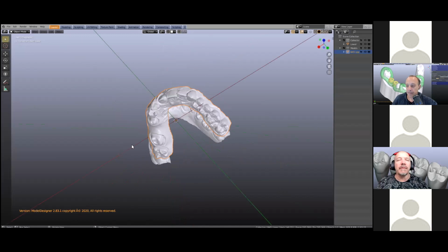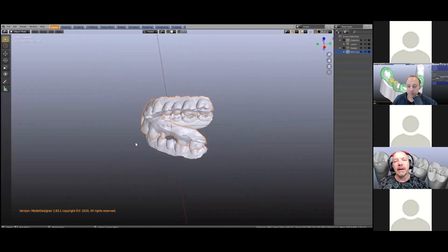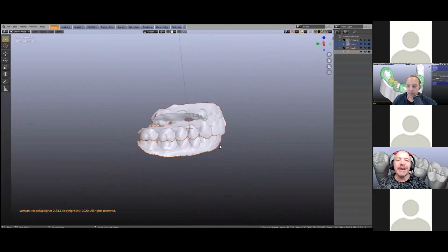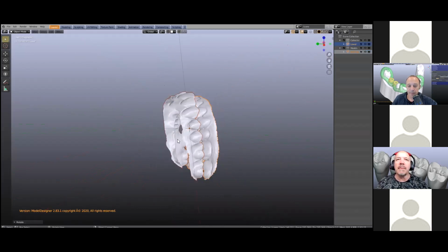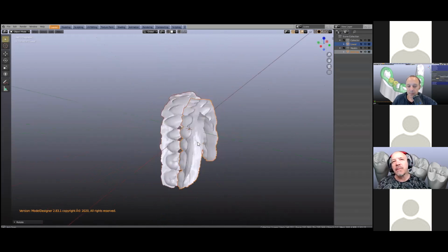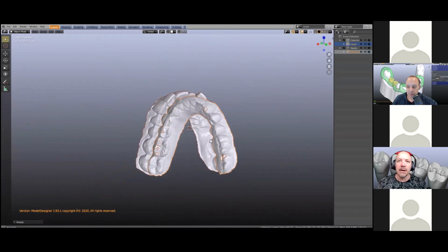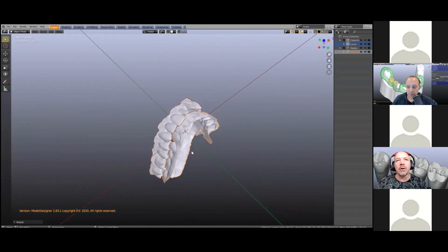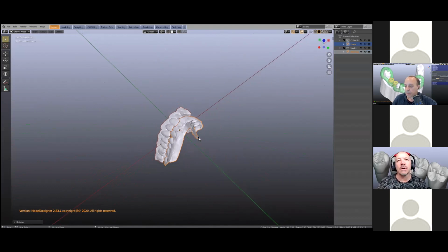Yeah, that's correct. I find it very difficult when they're facing upwards. Sometimes when you import from a different software, they may be imported this way around. And please don't start making your arch cut and trying to make models. I've gone on TeamViewer and I've discovered this. Obviously, this is not going to work because we're extruding it in the Z direction and not in the Y direction. So the models have to be face downwards, okay?